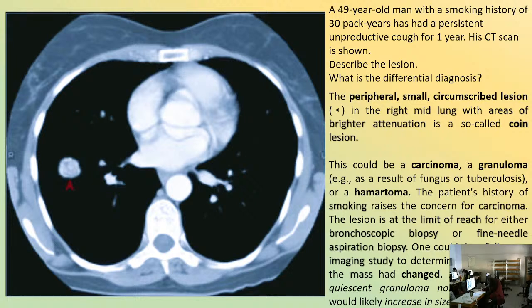And you can see that the center of the lesions becomes necrotic. One is the abscess due to bacteria. Other lesions, a tumor, which could become necrotic because tumor cells need to grow and their neovascularization may not be enough for their growth, so they become necrotic.